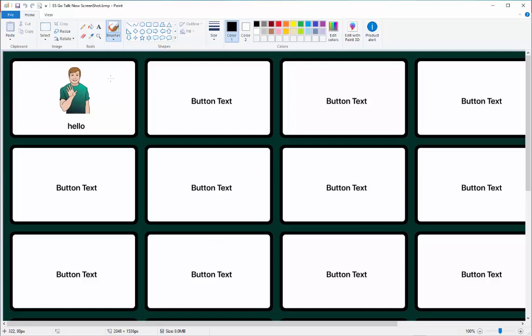Then as I move my cursor around the screen, and right now I'm over the top of the guy's head here in the upper left hand corner, and so it's a really tiny cursor, but as I move this around the screen, I'm going to move the cursor down to the bottom left corner of the screen. And if you watch down in this region, you'll see two numbers that change quickly.